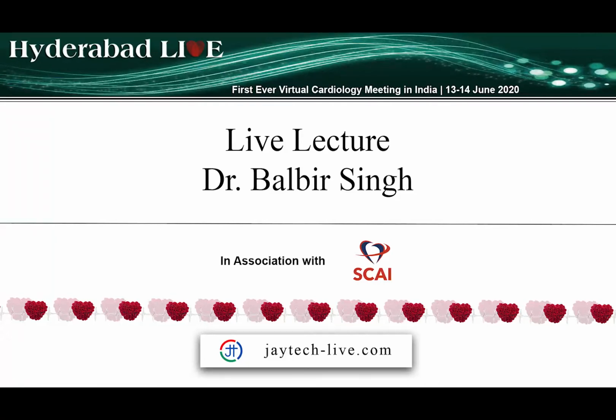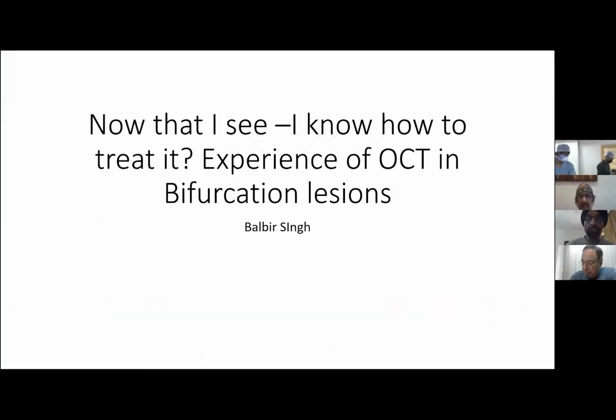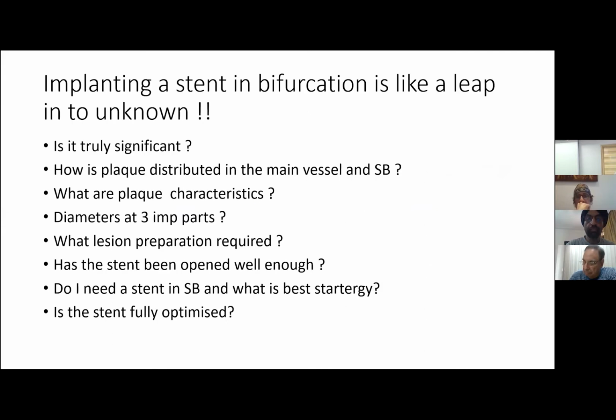So in the next 15 minutes, we will try to understand how OCT scores over IVUS and how bifurcation lesions are one very important area where OCT can be good. When we do a bifurcation, it is like a leap into the unknown.